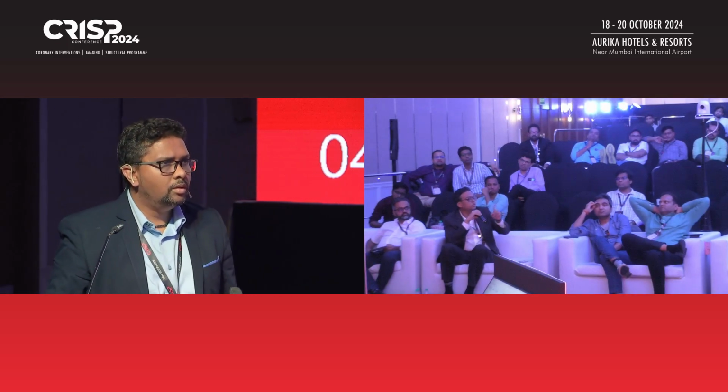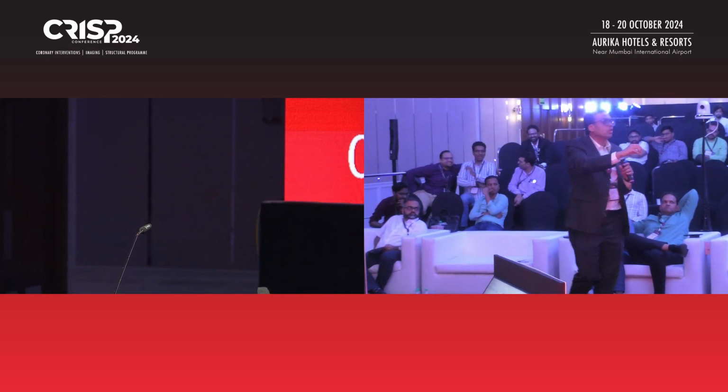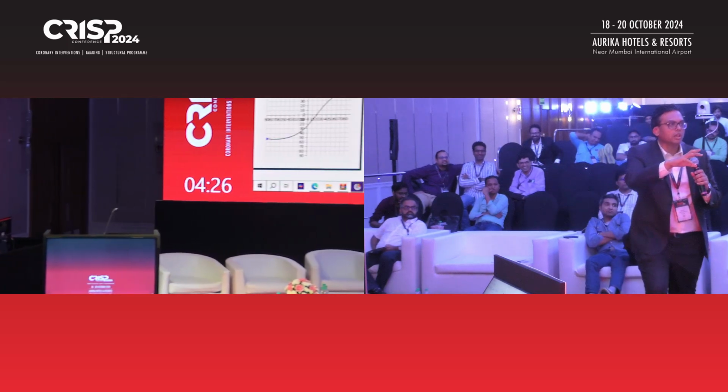Arvind, still we don't know what's the practical application in this S curve, because correct me if I'm wrong. Can I use this? I'm learning from you. Correct me if I'm wrong.